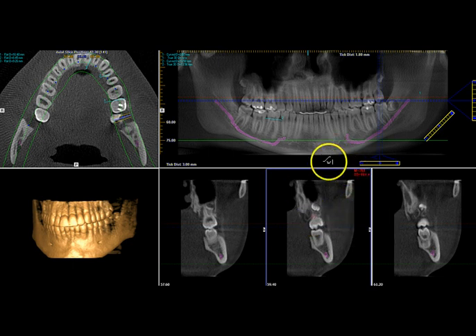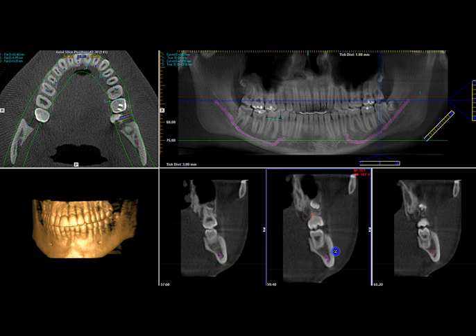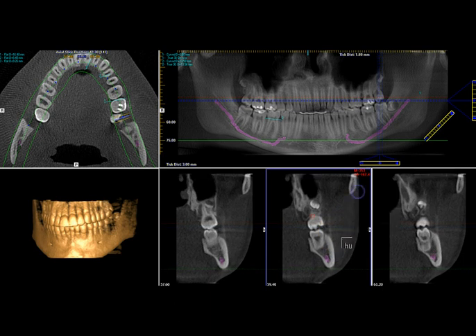So this is how we use the Hounsfield unit. Look at the cortical bone here. Let's measure that also. About 400, 500, 300, 400, 500. Let's see, mean average 500, and compared to the interior of the mandible, the thickness is about the same, but here's about 400 or 500, and over there is almost 500 to 600.